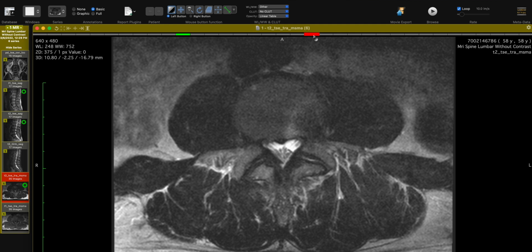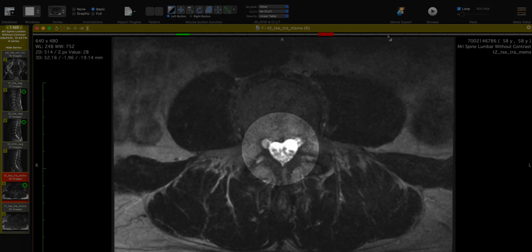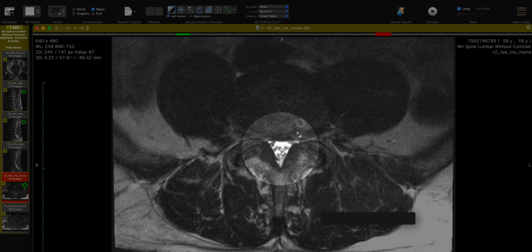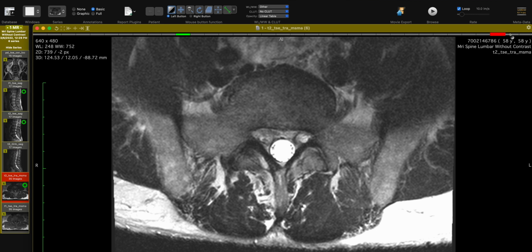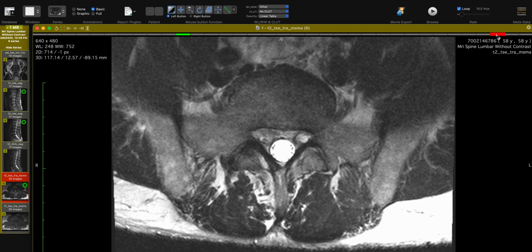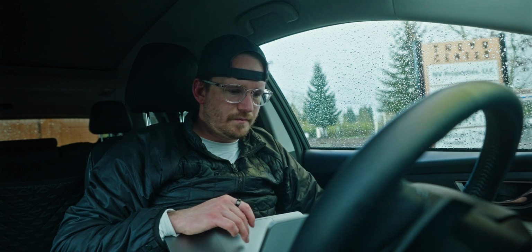and the foraminal canal. The central canal looks like a heart. The disc is pushing into the central canal a tiny bit. See how it got really circular. Now it's really triangular. The ligament is pushing into it. The disc is pushing into it. All these things are just saying his back gets used a lot when he moves. But again, I want to be really clear. He doesn't have a bad disc herniation. It's normal for his age. So we're getting down. See how L5-S1 looks totally fine. Nice central canal. Nice foramina. Yeah. So let's look at the T1.